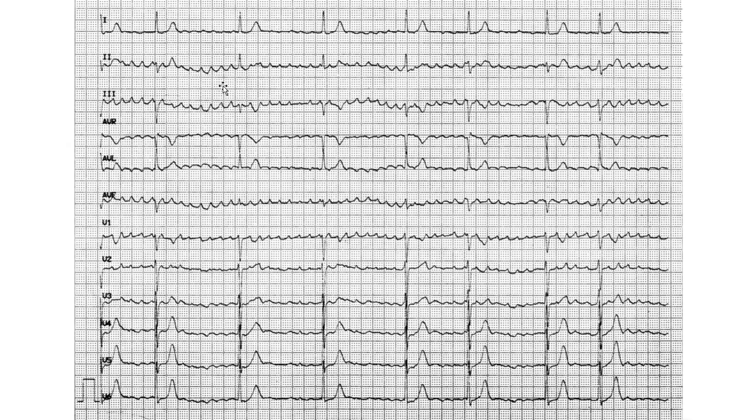If it is flutter or fibrillation, you do not measure the PQ interval, and this is quite tricky because sometimes, and trust me, it is very tricky to notice that it is fibrillation. So please keep it in mind. If you can't see P waves, or you're unsure about the P waves, always go through the entire ECG and check: is it possibly flutter? Is it possibly fibrillation?